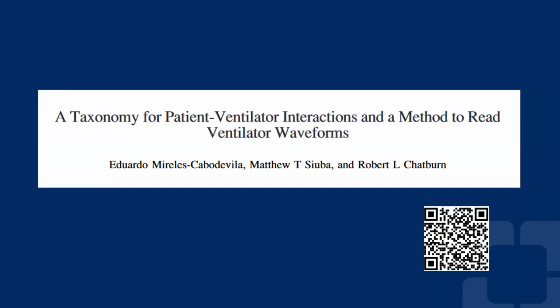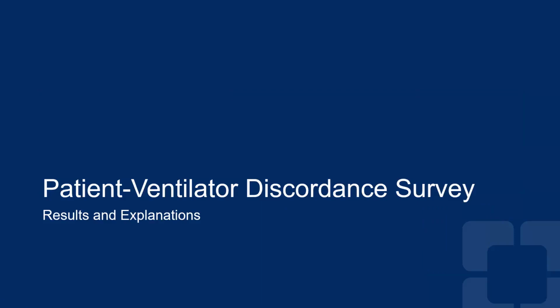And the reason for that is the presence of a prolonged time constant. Now, there are many other conditions that can cause this. This is just to highlight that the pattern that we're watching here is of obstructive lung disease. The reason we know this is because there is a prolonged time constant, meaning the time from when the deflation of the lung started all the way to the start of the next breath takes a long period of time for the flow to return to baseline.